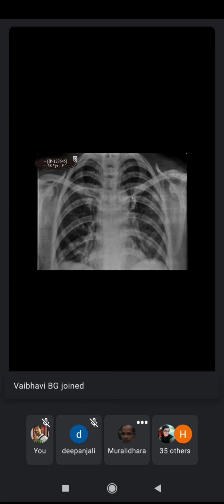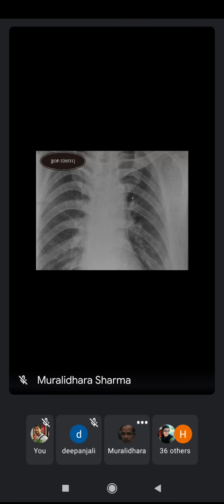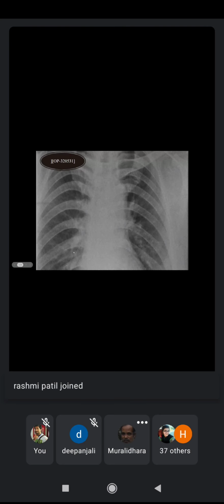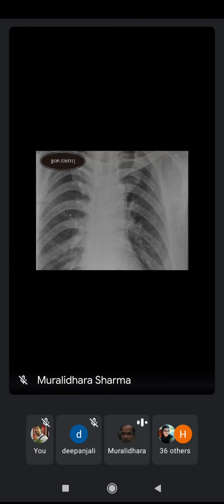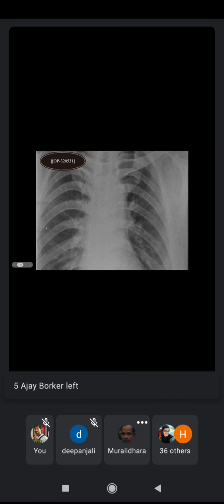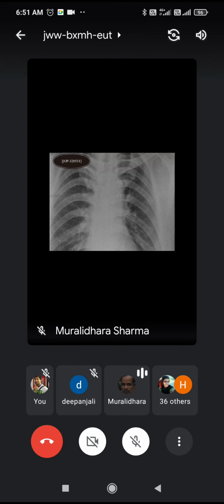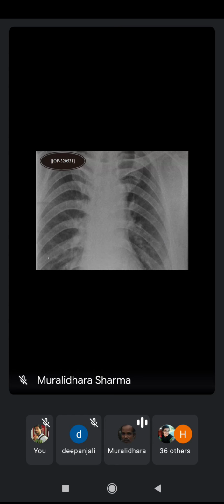Again, the pathology is the same. Otherwise, the findings are the same. The only difference is in the distribution of the lesion and the extent of the lesion. Now, one more example where the lesions are just a few bands, very few bands, and more of this mottling in the lung tissue. A mottling in the lung tissue is suggestive of recent onset.